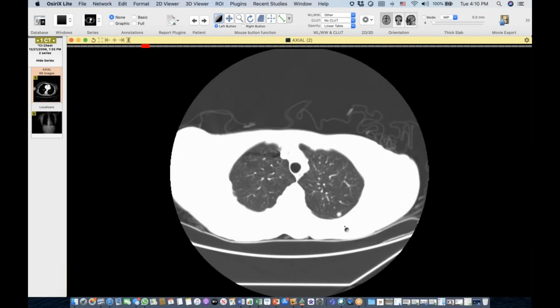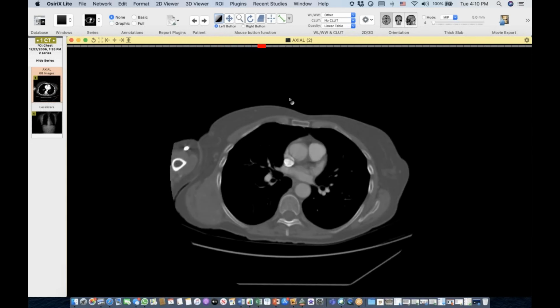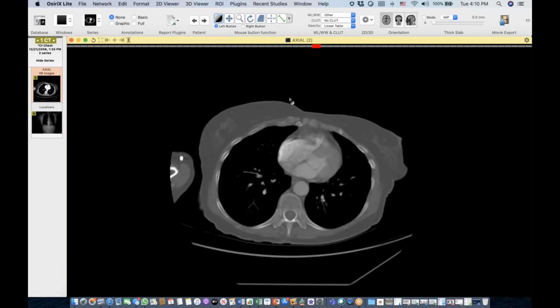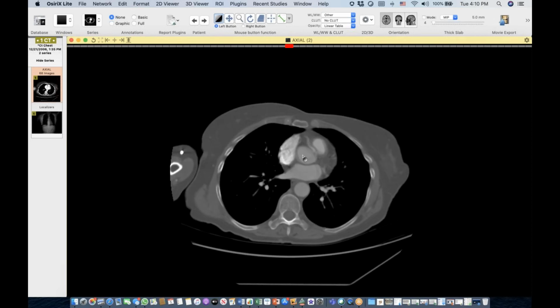Oh, there you go. Hey, Jacob, can you go back to the aortic valve real quick on this case? Something just caught my eye, and I just wanted to see again. Yeah, the aortic valve. Nah, never mind. I was looking at where the RCA was coming off too. Well, we were looking at these, but I think it's still coming off the right. Okay. Yeah. Oh, you mean this? Yes, I think it's all motion artifact.